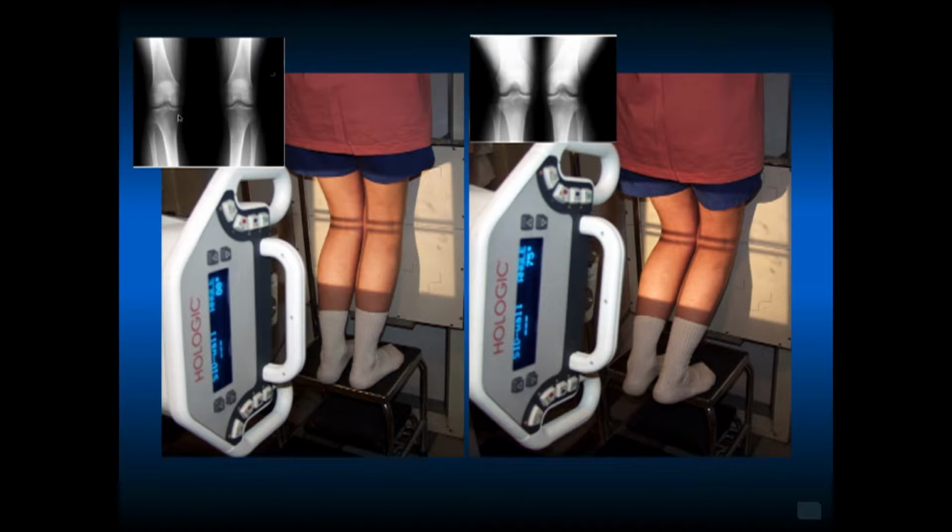You look for sclerosis here, and sometimes the sclerotic bone may be a better one for weight bearing. Somebody that has a lot of osteopenic bone or has alignment, this is in a bit of varus, but if alignment is in valgus, that may progress more quickly to progression of valgus or varus if the bone quality is not as good. So we look at the lateral space and the medial space here in this view that's 15 degrees flexed. The 45 degrees, or the Rosenberg view, you can see how now you see the notch.